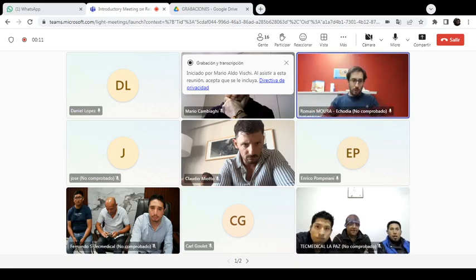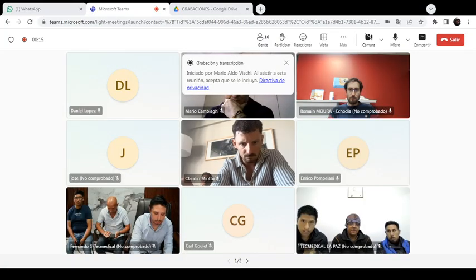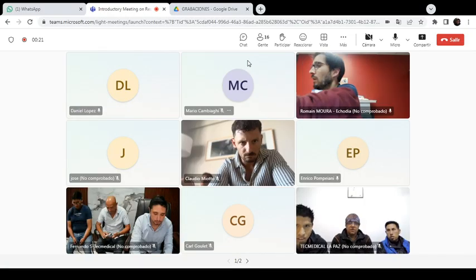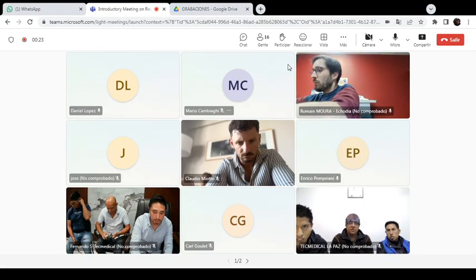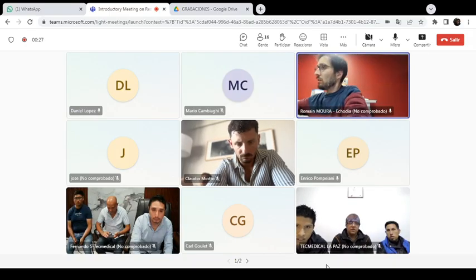If you want me to start, hold on, I'm checking my software. Okay, all right. I'm just picking up a device to show you a real case.